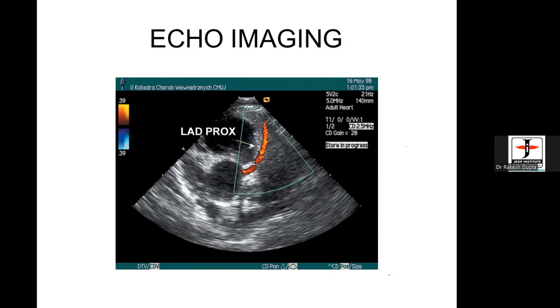At the present moment, only the proximal few millimeters of coronary arteries are seen in routine 2 dimensions echocardiography. Again, this is not something routine, and this is something you will develop on your own later.